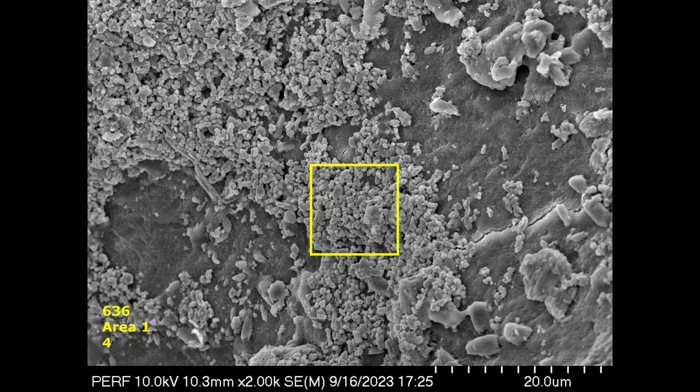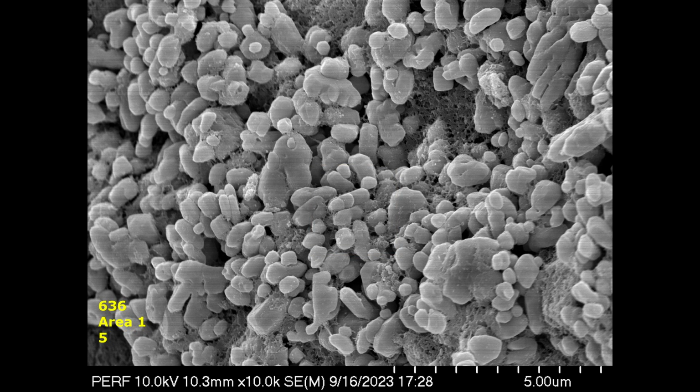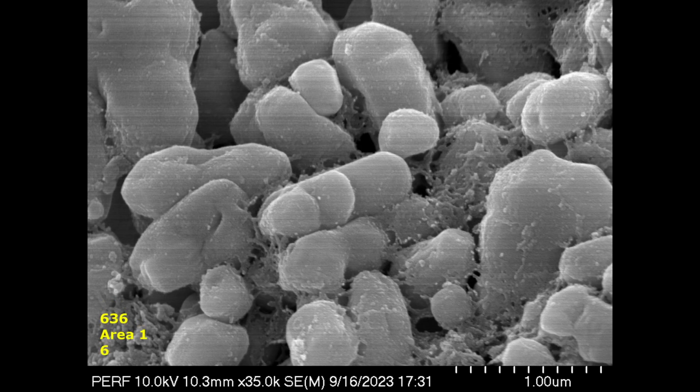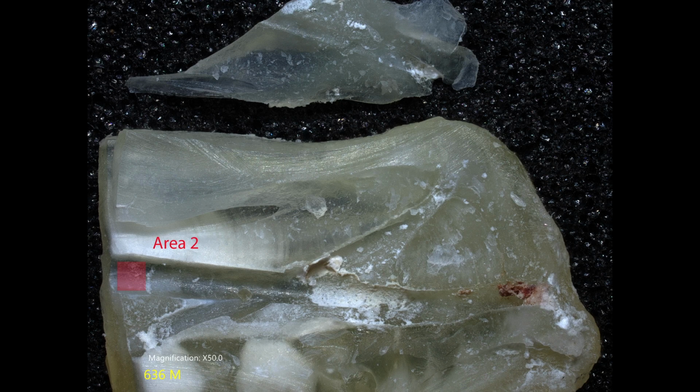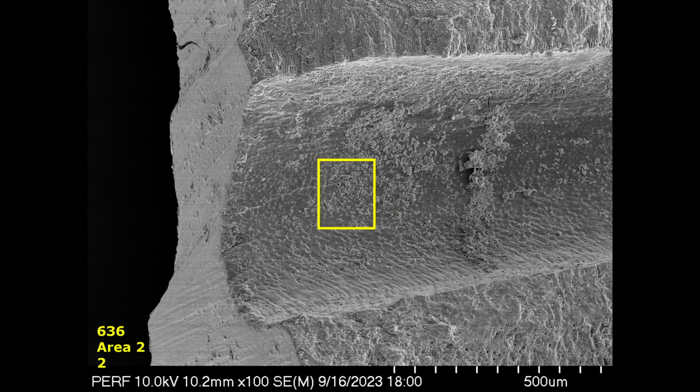And all of the dentinal walls were very similar to this. So you see a kind of a debris layer. It's not clear at low mag what it is, but when you go in at higher mag, you can see there is some dentinal debris here, some calcium hydroxide, but you can also see many morphotypes of microbiological organisms. So on the other half of the sagittal section, I looked more coronally. I did not see a laser signature in any of the areas that I looked at.